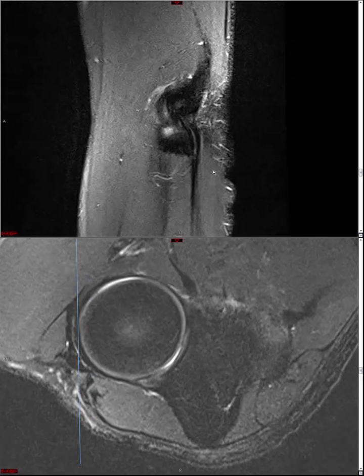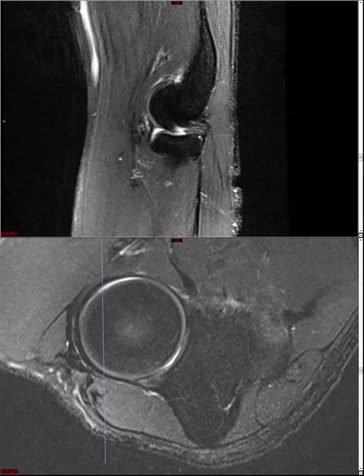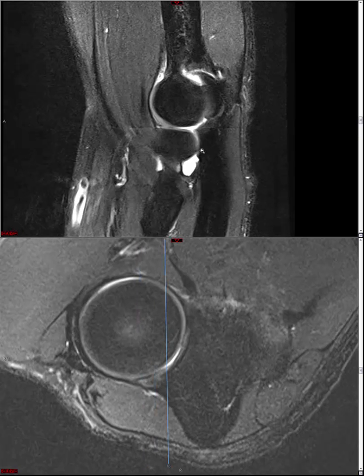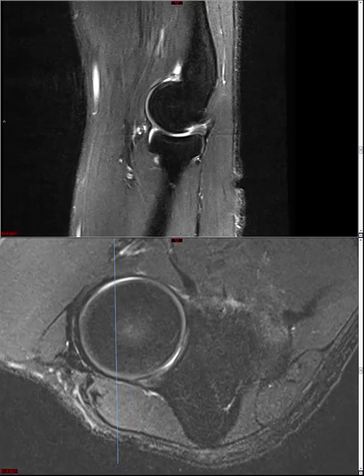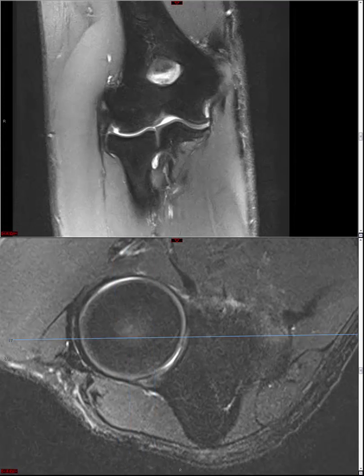So here we are, far lateral sagittal image. Here's our lateral ulnar collateral ligament, and it's going to come around the back here. It's going to cross the radial head and neck, and then it's going to insert onto the supinator crest. So here's the supinator crest of that proximal ulna, and it's this ligamentous structure here. But really, I would probably use predominantly the coronal and axial to assess the lateral ulnar collateral ligament.